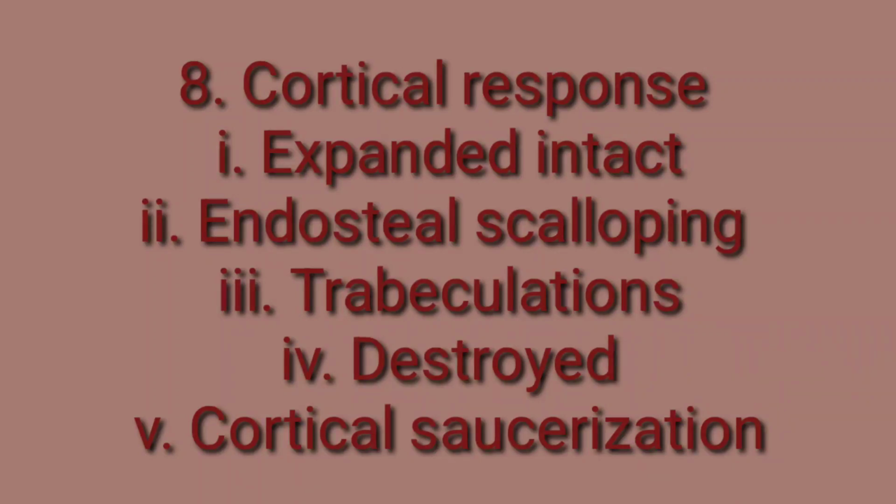Destroyed cortical response can be seen in rapid growth, especially in telangiectatic osteosarcoma, and cortical destruction is another point. So these points must be noted so far as the cortical response is concerned while reporting the X-ray, especially for MSK tumors. Soft tissue involvement is another important point while evaluating bone tumors, whether there is any soft tissue involvement associated with the bone tumor.